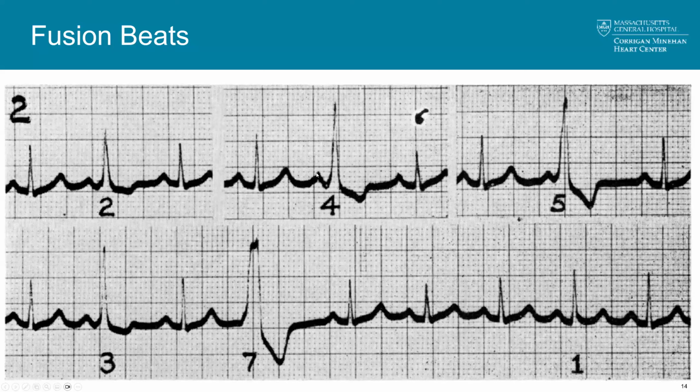Here it's more like 2.5, right, for beat number 4. And so the PVC is happening just a little bit later with respect to the P wave. The ventricles are having more of a chance to conduct from the sinus node. And as a result, you get an even more narrow QRS complex. It's a little shorter, that notch is gone, and so forth.